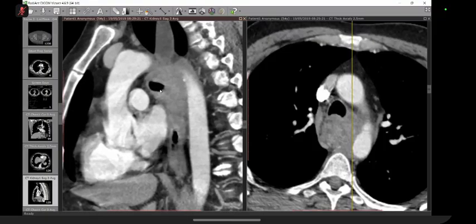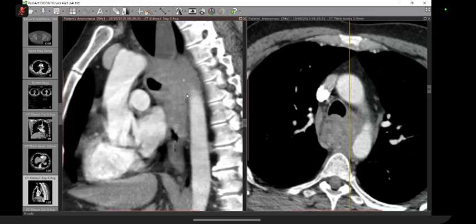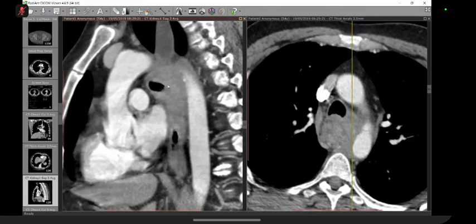This is in cross-section in sagittal. Do you see this small bit of soft tissue? One can imagine that as if it is projecting inside. Do you see this outline? You will agree that there is a bit of this, right? So in another case, if this was the only finding, I would have said that send to the respiratory for. But here, actually, one can see that you can imagine it has invaded the wall and is projecting inside, right?